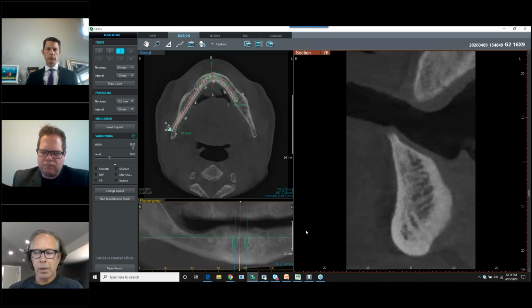But here's the thing. The benefit to what you're looking at right now in the tool here, and you don't have to memorize how it was done because these guys are pros at it. But if you're new to this, other than your take home being that you can do this, here's the take home for you clinically. When a denture goes in, unlike a fixed prosthesis, a denture has to have a path of insertion. So when you snap something in, there's a degree variance that you have to stay within, or you can't get the back to snap as well as the front.